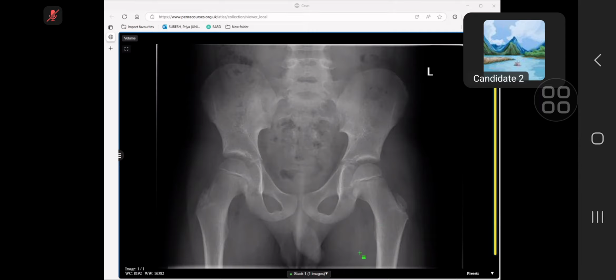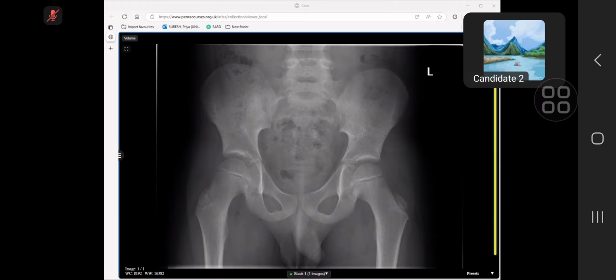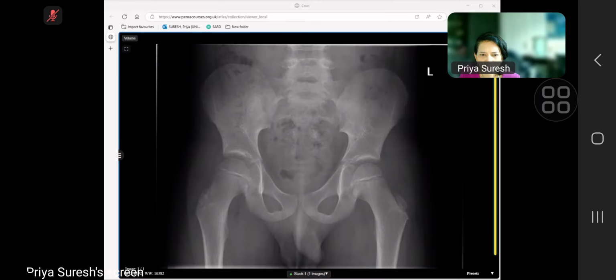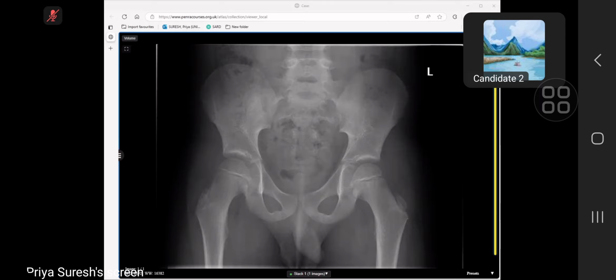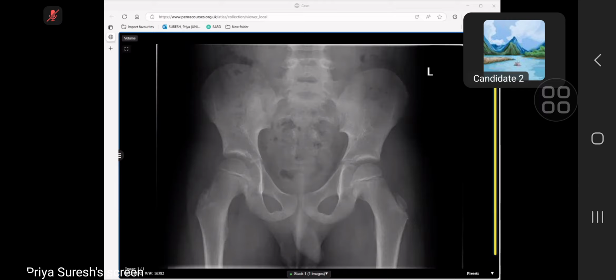Okay, so if the patient has presented acutely, as the soft tissue planes on the right side are somewhat blurry and hazy, plus the joint space is a little bit bulky and widened between the acetabulum and the epiphyseal head, I would like to know the history if the patient has presented acutely with some fever and redness.